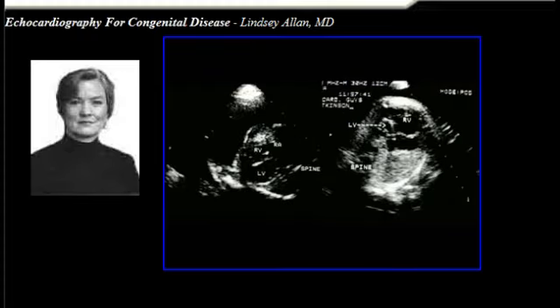Now, the other thing we can do as pregnancy goes on, and has proved very interesting for us as pediatric cardiologists, is to observe how congenital heart disease can change as pregnancy goes on. These slides represent the same fetus. This fetus is seen at 20 weeks gestation on the left panel. The same fetus is seen at 32 weeks gestation. And here on the left side, the spine is over here, and what we were seeing was that the left ventricle was dilated, it was poorly contracting, the walls of the left ventricle were echogenic, there was a critically obstructed aortic valve. So this was critical aortic stenosis.